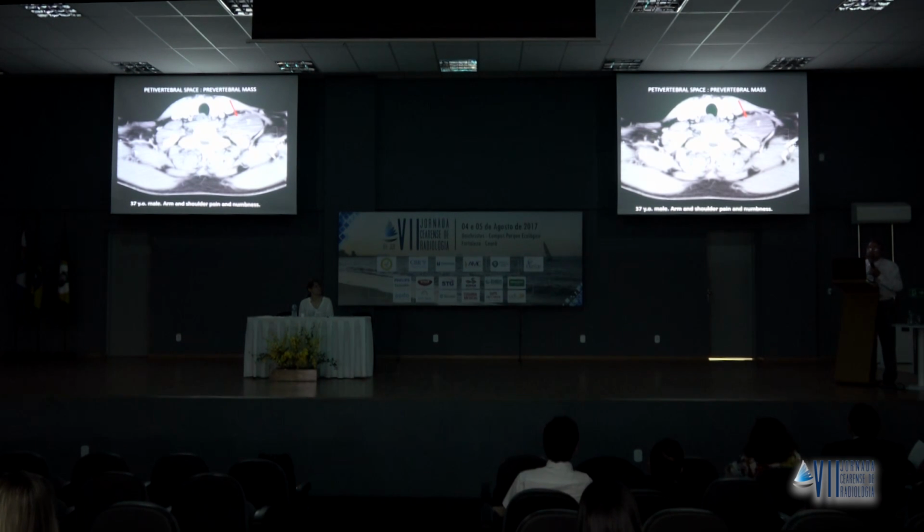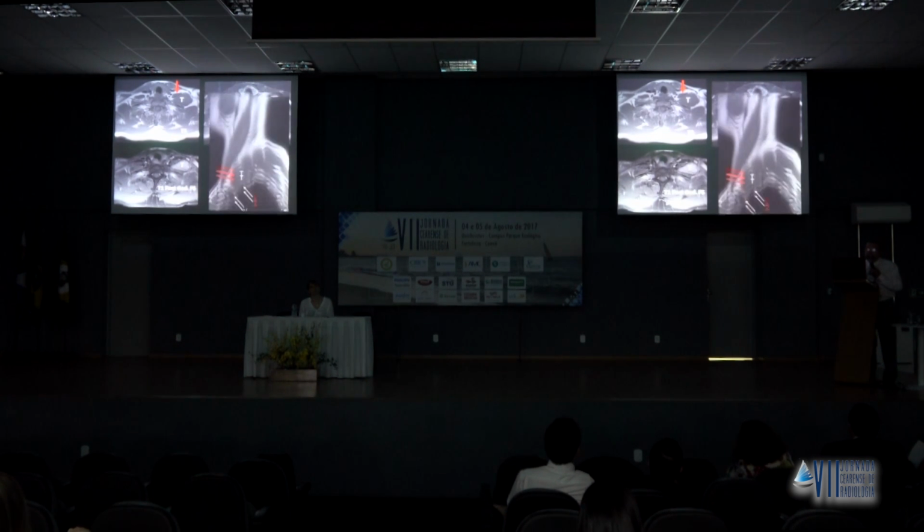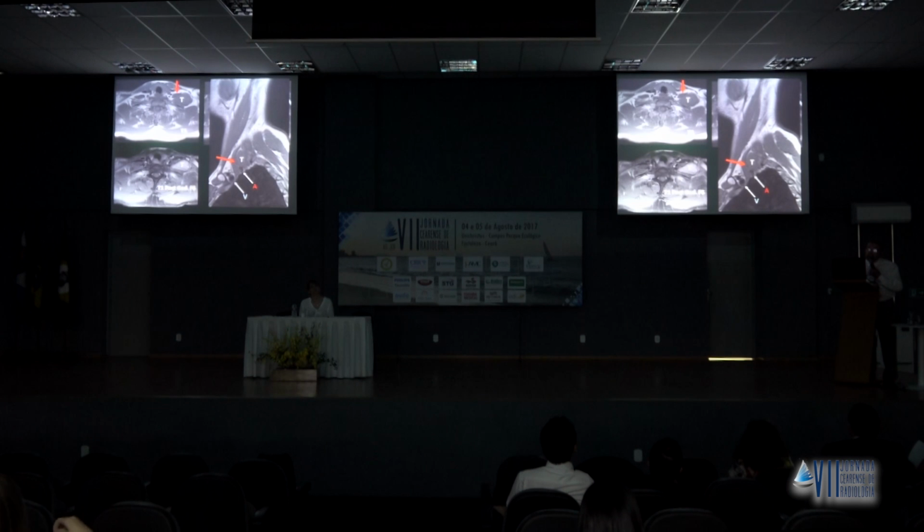And this, on the MRI, is a typical neurofibroma of the brachial plexus, displaces the anterior scalene anteriorly, is brighter on the STIR and enhanced with contrast. And very clearly, you look here the anterior scalene and posteriorly the middle and posterior scalene. Between the two is the tumor. And as you remember, this is the scalene triangle.